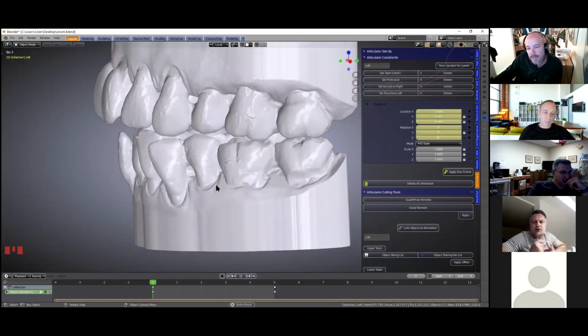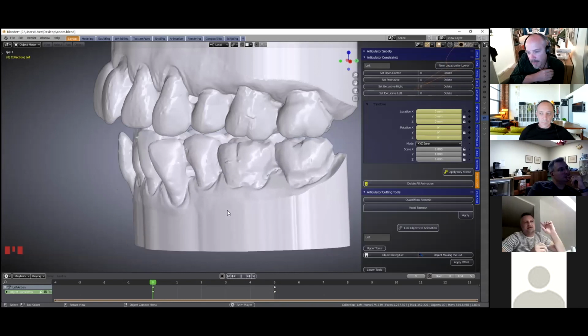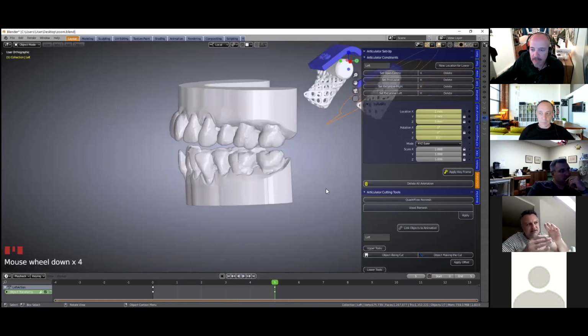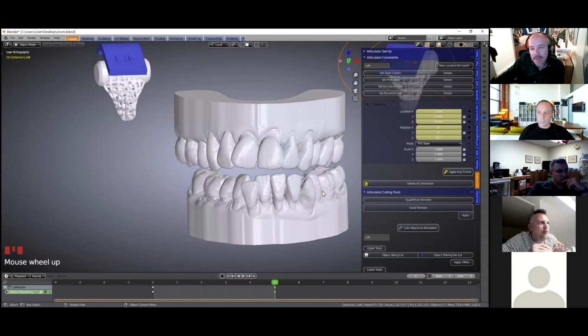When you finish your articulator move in this 2 millimeter higher occlusion, is there eventually a possibility that you reduce the vertical dimension by 1.5 or something, and do you need to make all the sequences again after reducing, or is the main point of the procedure to start to define how many millimeters you want?